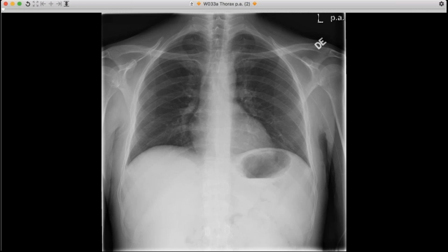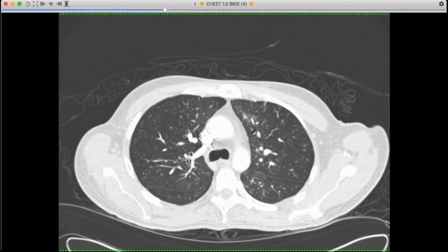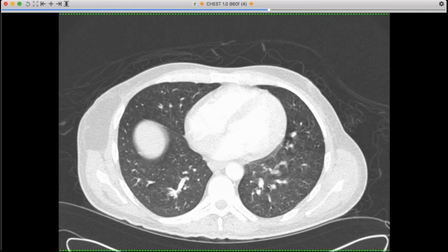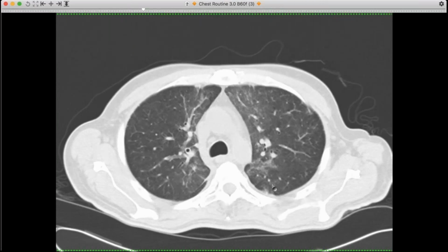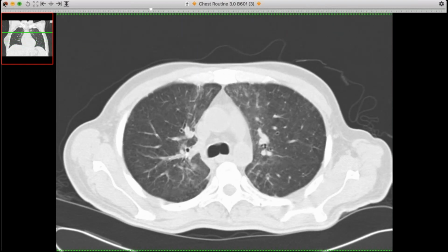And then they got treated, and this was the first post-treatment CT, and you can see starting to develop some ground glass opacity, very vague looking organizing pneumonia-like stuff just in the central lungs, not much out in the periphery. And then this was 2 weeks later, and there's a little bit out in the periphery, but the majority of it is in the old treatment field. Gosh, that's interesting. And this was on a chemotherapeutic agent like gemcitabine, which causes a ton of lung injury.